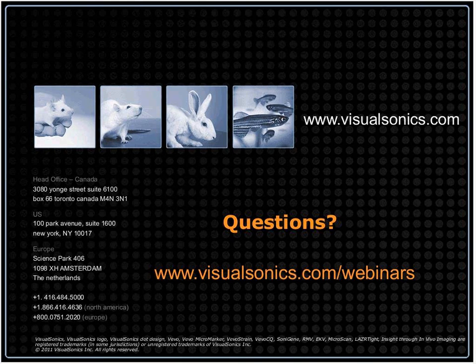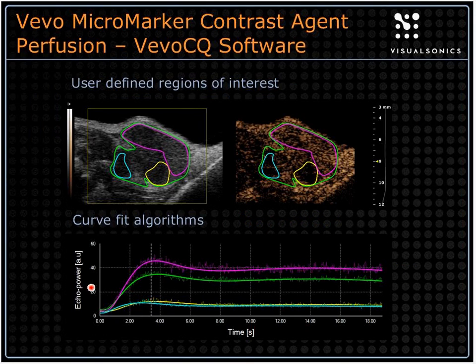Okay, thanks. The idea behind the 20 seconds is that generally for most tissues, a 20-second stream of images gives time for the microbubbles to perfuse into the area of interest and to come up to a constant circulating level of perfusion. So if you think back to the curves that we showed, this allows you to reach a peak level of circulation.